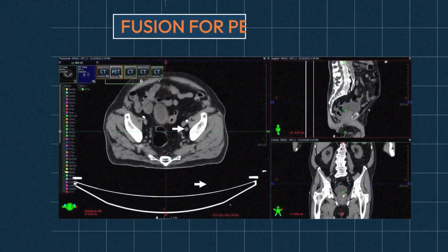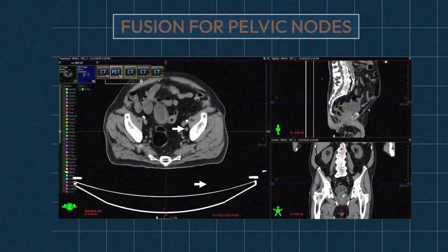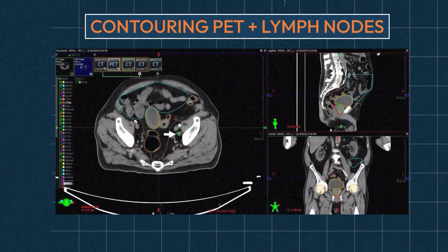As far as the lymph node goes, here we really don't try to identify substructures within lymph nodes. We're really just trying to identify involved lymph nodes. So we know that based on the prior images that this lymph node in the panel on the left is the one that was highlighted with the PET signal. So we can now contour that lymph node based on the anatomic information from the CT.